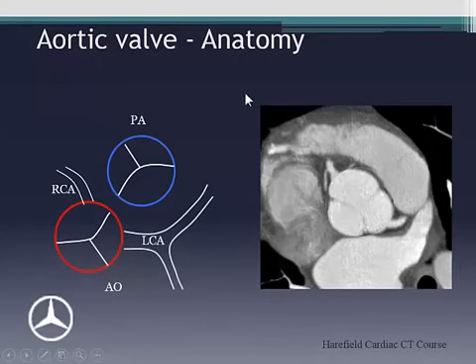So in this case, we know that the anterior chest wall is here. The most anterior sinus is going to be the right coronary sinus, and surprise, surprise, it gives rise to the right coronary artery. And similarly, the one a bit more posteriorly gives rise to the left. The pulmonary valve is a mirror image of that, okay? So you've got the anterior, and then you've got the left and right. So it looks like a mirror image.